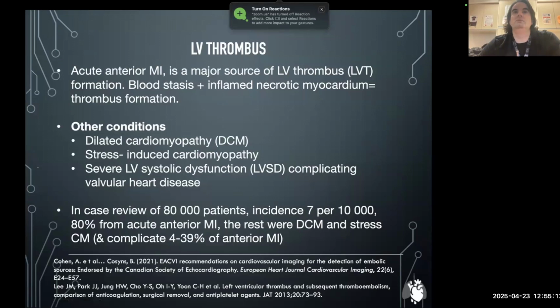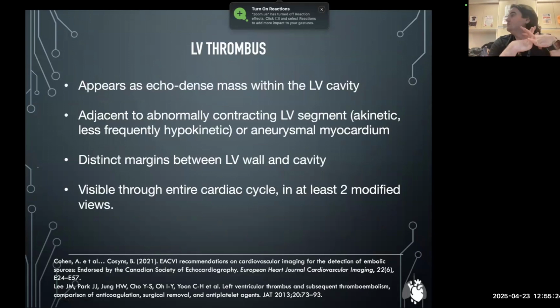Teaching point case, guys. So remember that cardiology had done a contrast echo from before. What ends up happening is that the contrast that they give is usually some sort of proprietary name like Definity or whatever they're called. The idea is that the contrast is actually little microemulsifications mixed in fat that are smaller than red blood cells. So what you do is you inject them, they light up the right side, but remember the agitated saline gets filtered out by the lungs. Yep. These microemulsifications are so small that they can actually pass through pulmonary capillaries and make it to the left side. So that's how you can opacify the left-hand side.